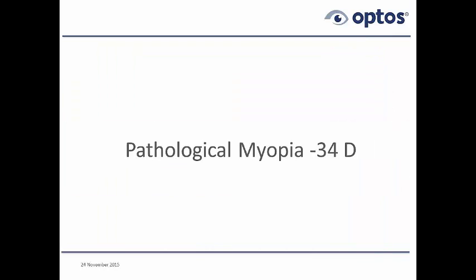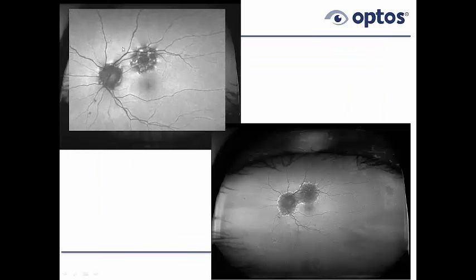In that Azor case, I think we're able to see that. Yeah, right over here. So we can see here, this is early on. So these are lighter zones over here, and at least over here, it's sort of filling in. You can see it's going across. So this one is a fairly good example of what's happening. Of interest, when I took the image on this day, we saw a bunch of spots around it that were hyperautofluorescent, but remarkably, in just a period of like 6.5, 7 weeks, this extended all the way across and came very much closer to the fovea. So here's an area where some of these zones have become black, and some of the white ones have actually filled in. You're getting more of a white zone around it. But if you just do the comparison inferiorly, you can see it clearly grew, it clearly got closer to the fovea. This distance is certainly much larger than this distance. So it's much closer to the fovea 6.5 weeks later.